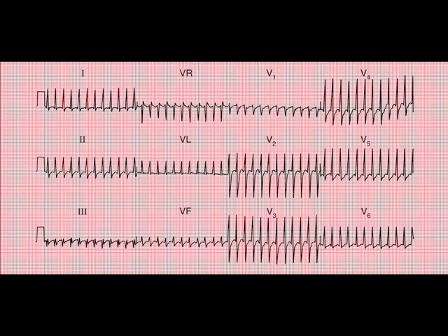The big question is, is this patient in sinus rhythm? So you need to look at the rhythm strip printed along the bottom. You don't have one, that's fine. Look at lead 2. Well, this is a very, very fast heart rate, and when rates are very high, it's almost impossible to see a P wave. You might see a bit of a P wave, or you might see no P wave at all, because even if it's there, it's blurred in or disappears into the QRS complex. What you're seeing between the R waves here could be a P wave, could be a T wave, impossible to say. So at the moment, we cannot say with certainty that this is sinus rhythm.